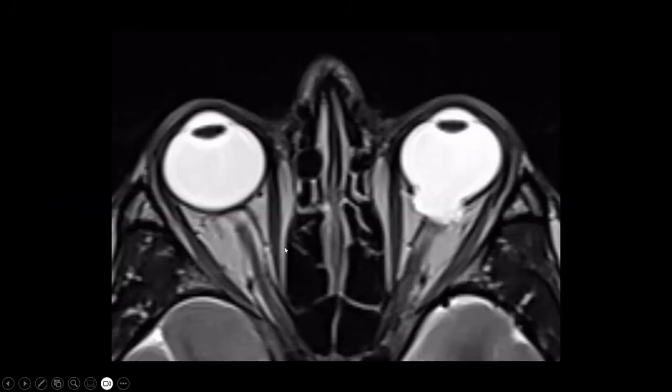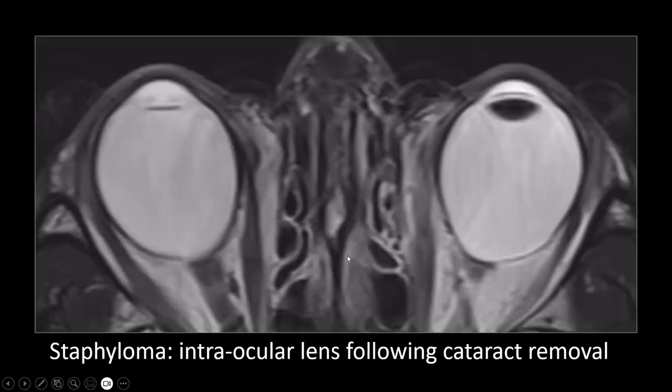In a congenital coloboma, we see a focal protrusion of the eyeball posteriorly, nicely at the level of the optic disc, while in a staphyloma, and this patient not only has a staphyloma but also an intraocular lens implant over here, but that's not that important now. In a staphyloma, we see basically an abnormal eye shape, mostly of the posterior component of the eyeball, but it's not exactly located at the level of the optic disc and often more temporal of the optic disc, as you can see here. What is a staphyloma?